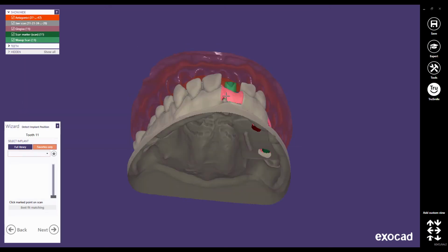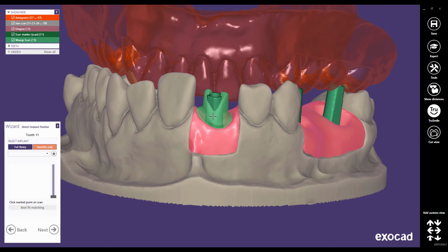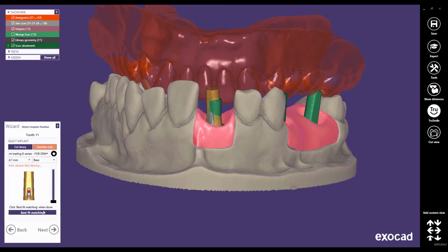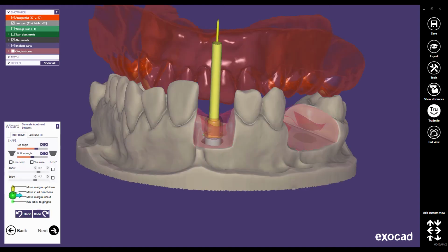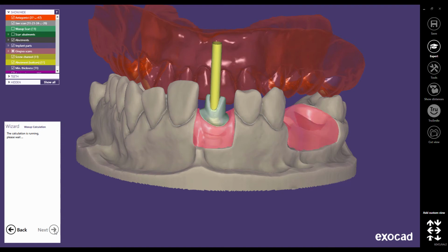Okay. Now we see here our initial abutment design, which is in the same coordinate system as the jaw scan. And now you have to do again the scan body registration with the new desired implant interface. And now you only need to click next. And the software automatically calculates the new abutment with the initial design as a wax-up.